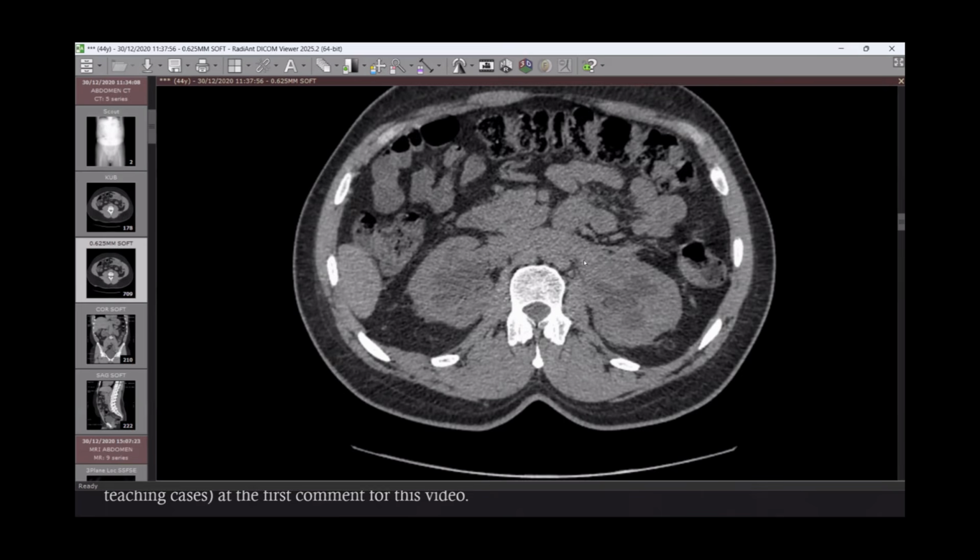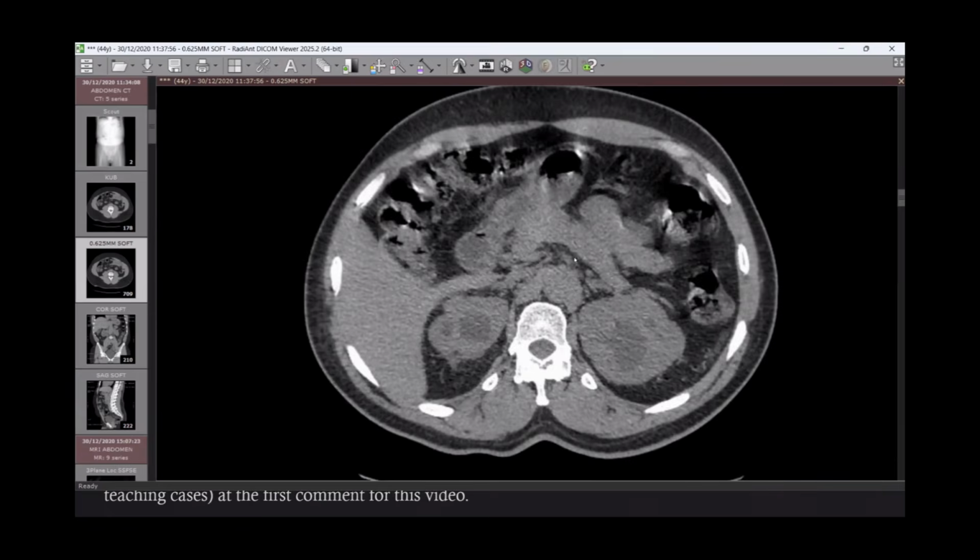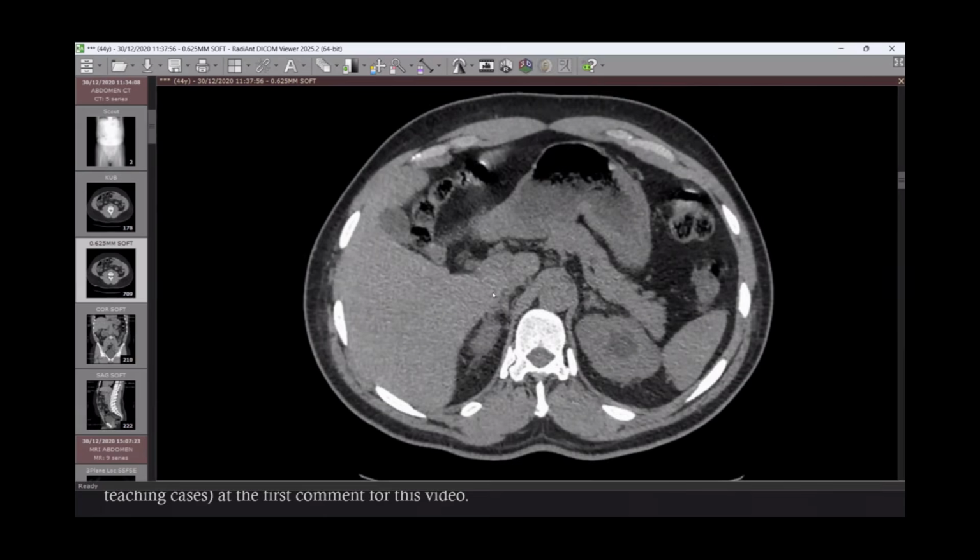And maybe one of the presentations of IgG4. If it is IgG4, what should you do, what should you describe here in this case? I would like to see the other manifestations of the IgG4 related disease, which could represent autoimmune pancreatitis. We don't have any autoimmune pancreatitis. Yeah, very nice. Okay, what else?